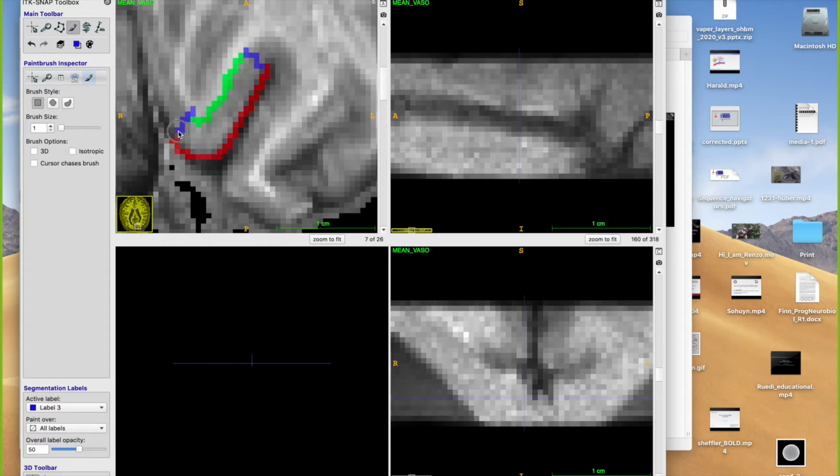And we talked about this in the hallway just now. In ITK, there are other tools available to fill stuff. Now I don't know how you can select. Go here, Renzo. Wait, this is useful. Go here. Do you see my arrow? I do. I will fill it up, and then I will.